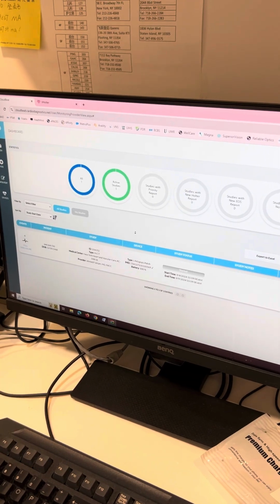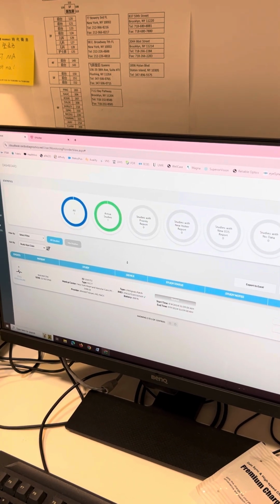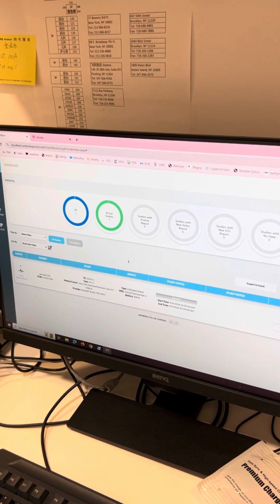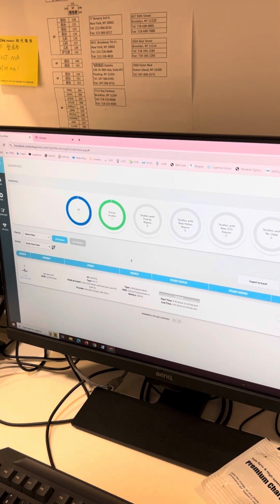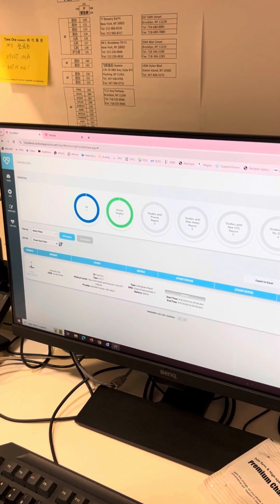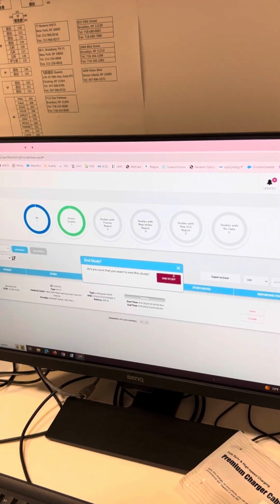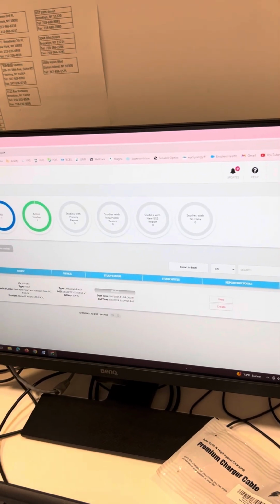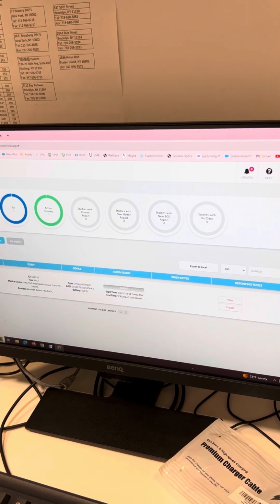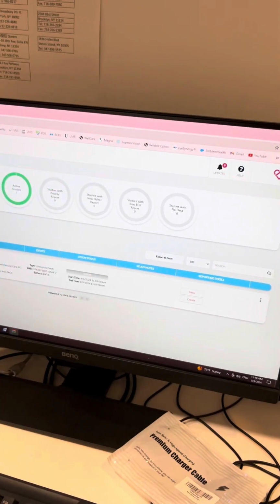All right, this is what I want you to do. Keep wearing this, but if you get a patient, you need to end your study. Once you end the study, you can rip that off and throw it in the garbage. The way you end it early, because we did it for 5 days, but since it's just you, we can end it early: all you have to do is click on that and hit end study, and then hit end study again. So I'm going to let it go for now, but if you need to use this license, you're going to have to end your study first, because you can only have one study going on at a time.